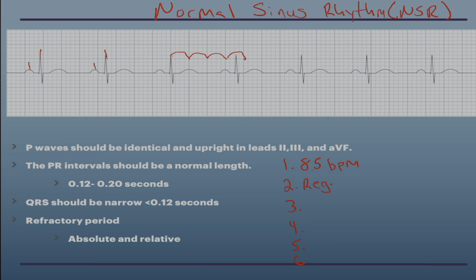The next thing I'm looking at is the P waves. I'm going to know a couple different things about the P waves. One, are there P waves? And two, is their morphology similar or identical? Well, I can see that these P waves look the exact same, and they're P waves. So yes, there are P waves and they are the same.